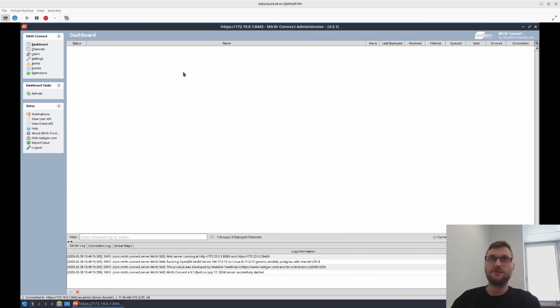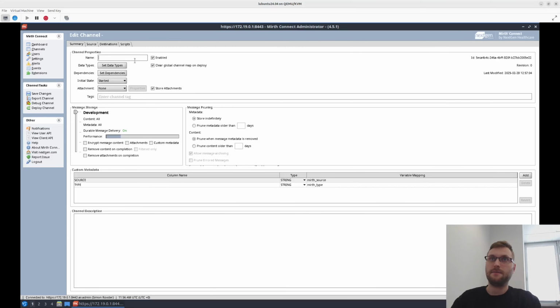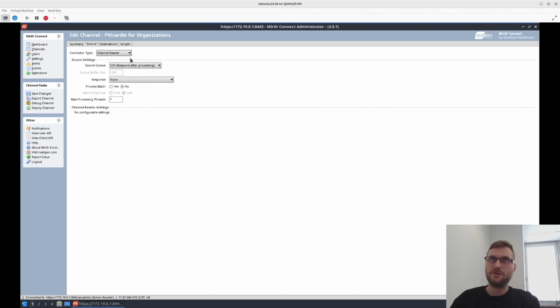This Mirth installation is completely empty. You are most likely going to have some channels in this Channels tab, but I will have to create a new channel from scratch. I will call it PMcardio for Organizations, and I will now go ahead and configure it. At your institution, your channel will likely already exist, so the Source tab will already be filled out with whatever the ECGs are coming into Mirth or your integration engine from.